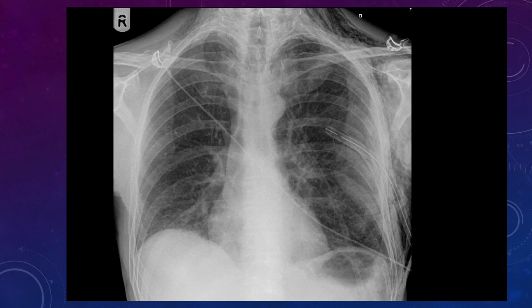Okay, it might be something called Boerhaave syndrome, where they get excessive vomiting and they get a small esophageal tear and they get a little bit of air tracking up the mediastinum. You might see it down by the heart, pneumomediastinum. So again, it's picking out, why have they got surgical emphysema? Have we got a decent explanation for surgical emphysema?